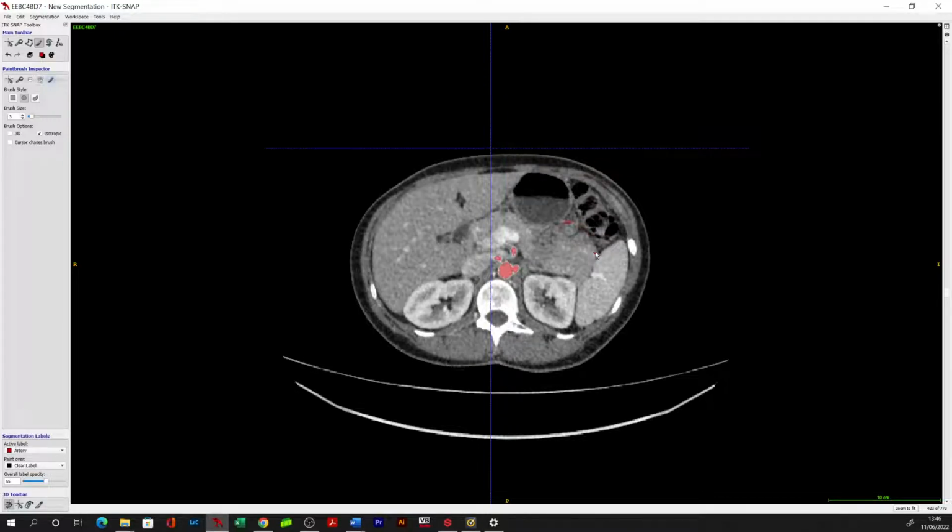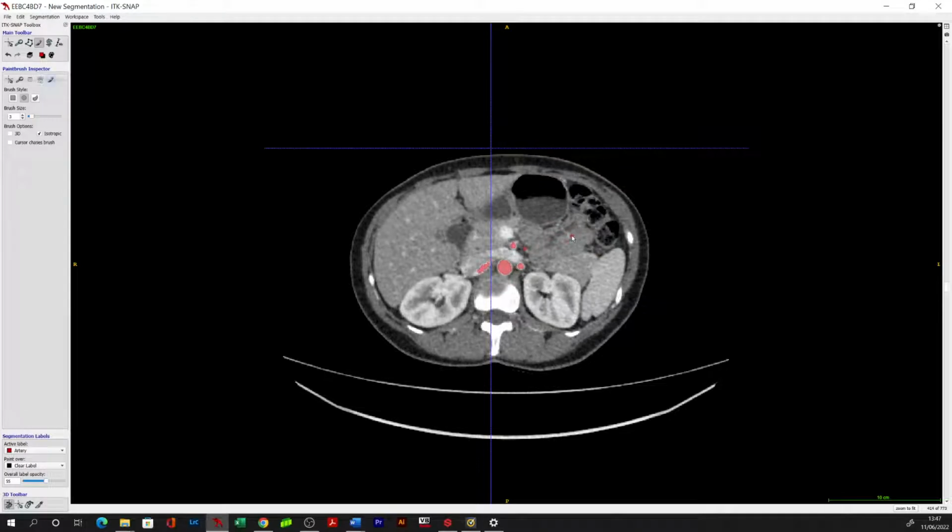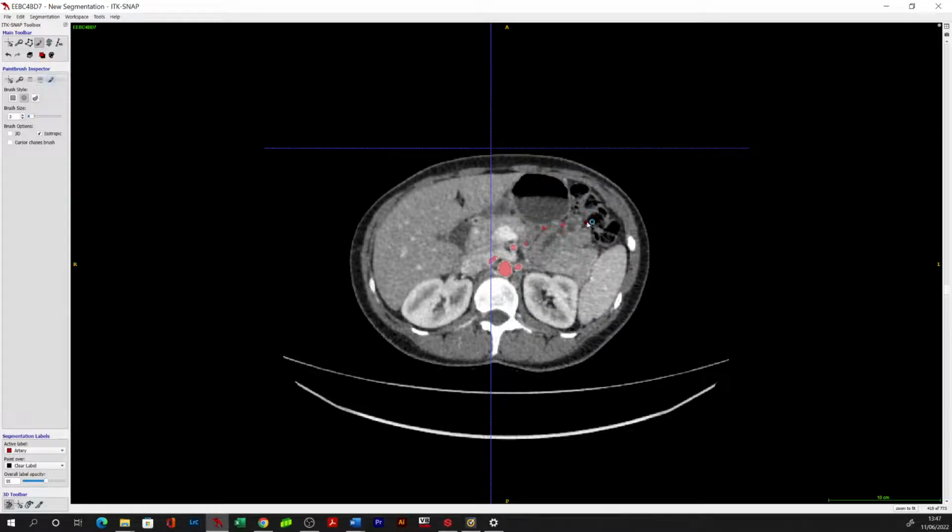If you can identify them, brilliant. You may not be able to identify these across their entire length. Certainly if you've got a patient like this who's quite skinny, and skinny patients are paradoxically harder to interpret on the imaging because of the paucity of intra-abdominal fat that helps you differentiate. You want quite a fatty mesentery, ideally, because it is much easier to help identify the vessels.